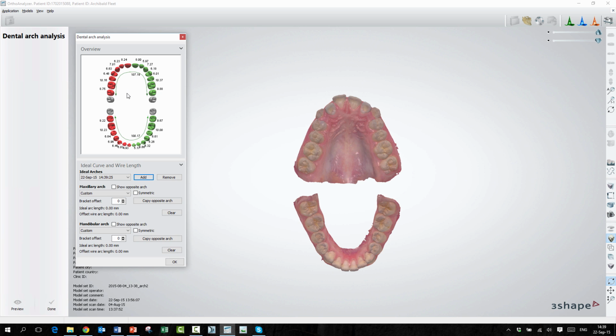Yeah, and we obviously have a separate video on teeth segmentation, so please check that out. And this number here is all the teeth added together. Okay. So this is the arch wire length added together with these teeth. Yes. Good.